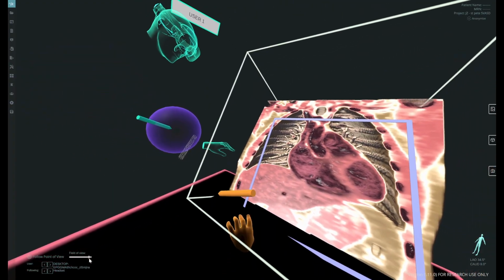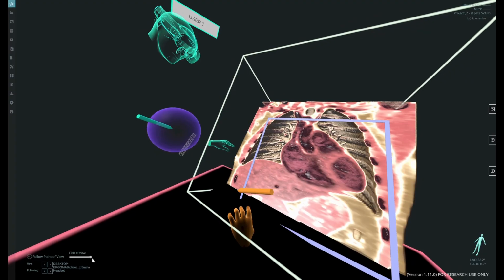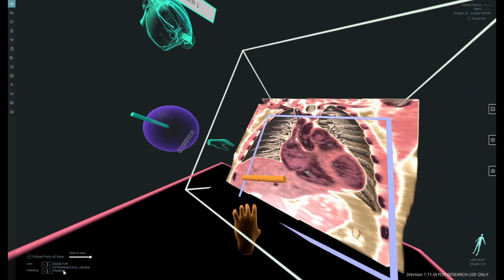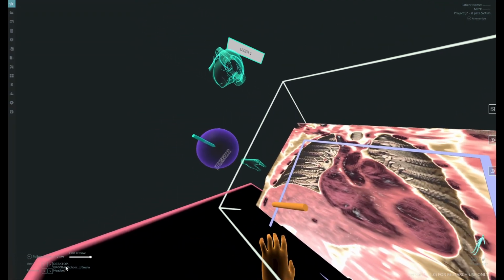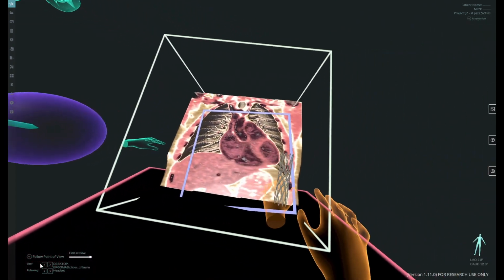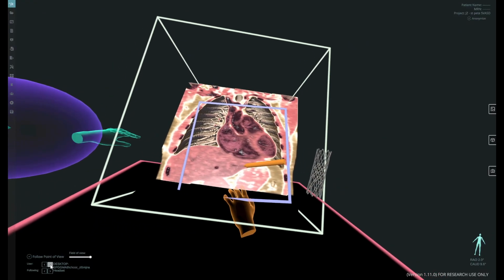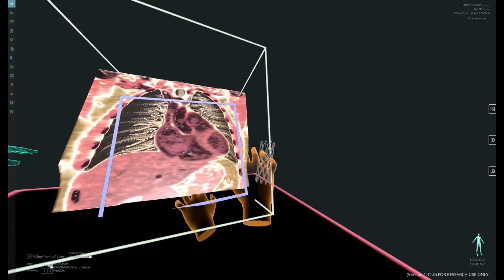The nice thing is that we are using the tables used at the bench for the shortening of the stent with certain diameters. So right now the initial one is 12 millimeters. So at this point it is 7.8 centimeters in length. And that's going to change as we work with it. So I'm going to bring it here in view. I'm going to go up to a more realistic diameter. So I'm going to be in the mid-20s here.